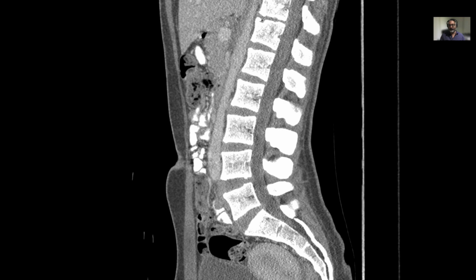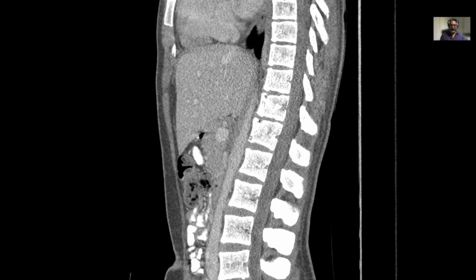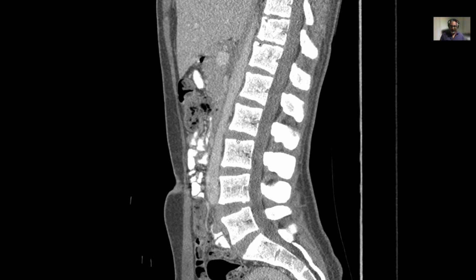The thing you have to see is the alignment of the vertebra. The lumbar vertebra, as you may know, have a normal lordosis, as the thoracic vertebra have a normal kyphosis. So in the lumbar vertebra, you'd like to see a normal lordosis. You'd like to see the anterior and posterior lines inside and outside the vertebra more or less aligned. These are well aligned. You don't want to see too much subluxation or movement outside.